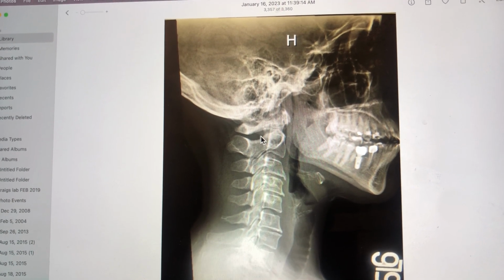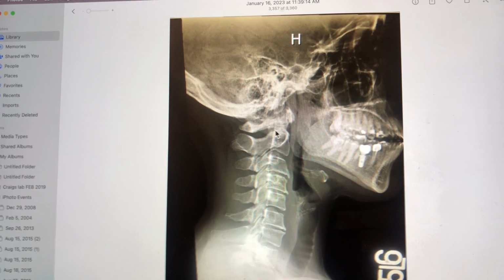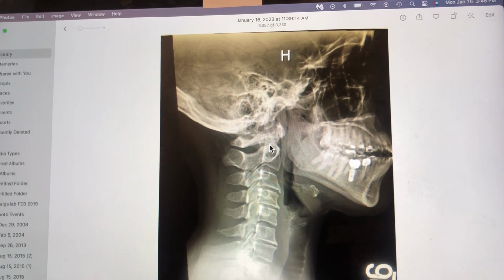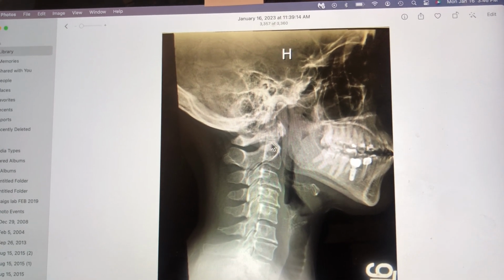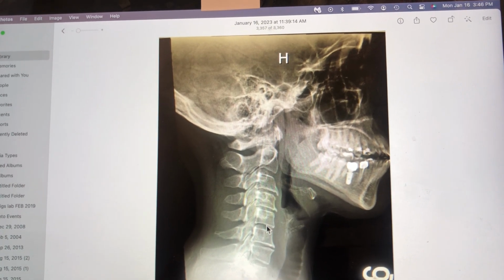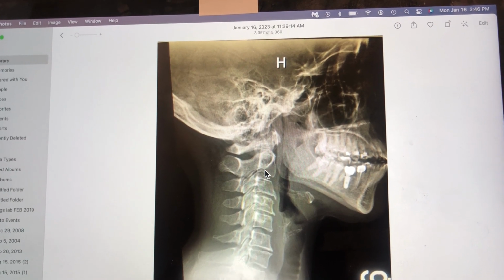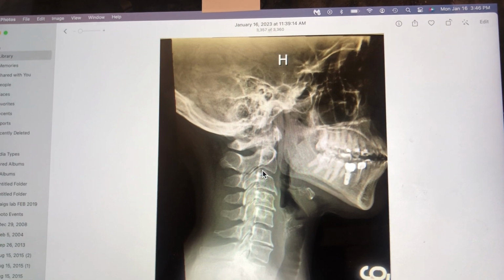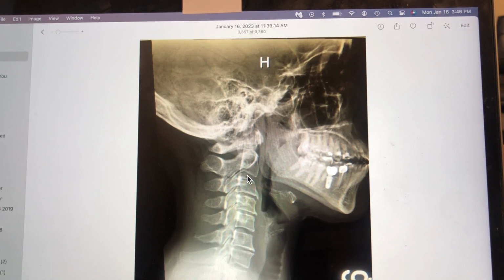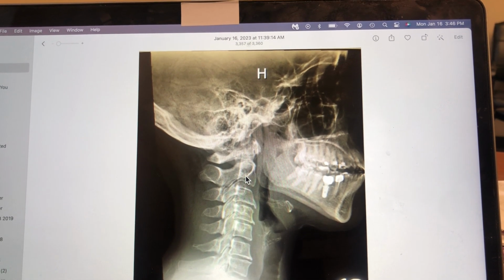And what's unique about this joint down here between the first and second vertebra is that this is where most rotation of your neck occurs. So if you rotate right and left, side to side, most of that movement is happening here. These other joints contribute some in terms of nodding and in terms of rotation, but mostly what happens here is bending your neck side to side, as well as putting your chin down to your chest or looking way up at the ceiling. That's what happens throughout most of these.